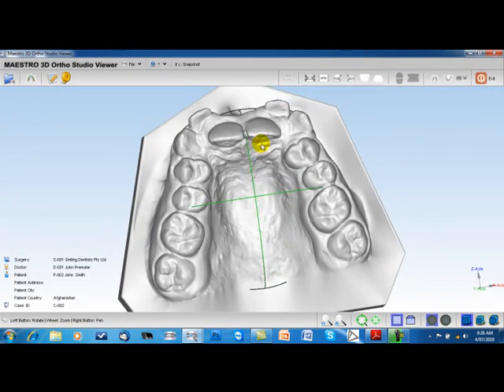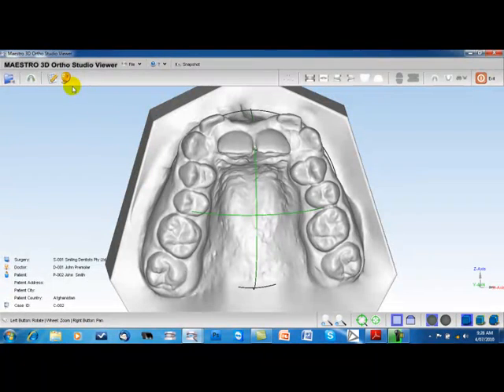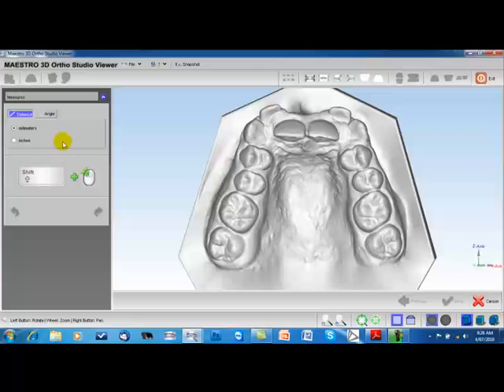And the last thing that I want to show you, well, there's two last things I want to show you actually, is this is the tape measure tool. And what that allows you to do is just measure distance or angle. So in this case, I'm going to just measure a distance. So I hold the shift key down. Again, it shows you what to do over here. Hold the shift key down, double click, and double click another point, and then it will show you the measurement. If you wanted to do an angle, for example, 3 points for an angle, click, click, click, and then it shows you an angle.